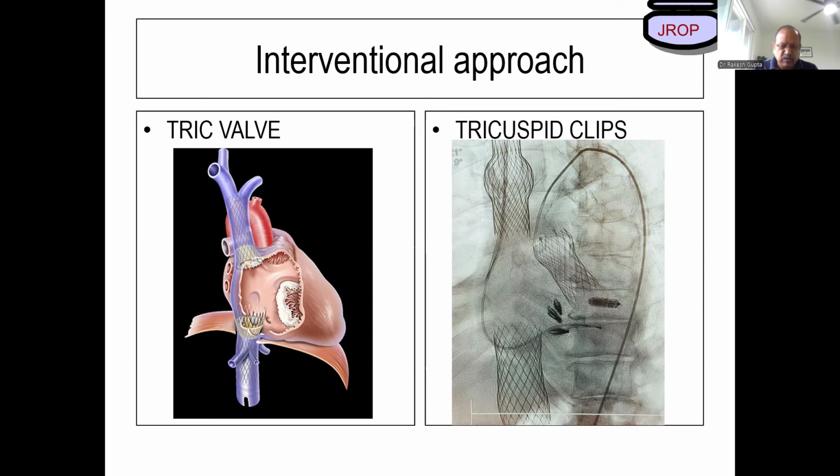So why were you expecting the patient to be in shock? I was expecting there should be RV infarction and therefore the patient has gone into shock. Correct. But echo was not showing RV dilated, but IVC was dilated. RV was not dilated and it was okay for contraction.